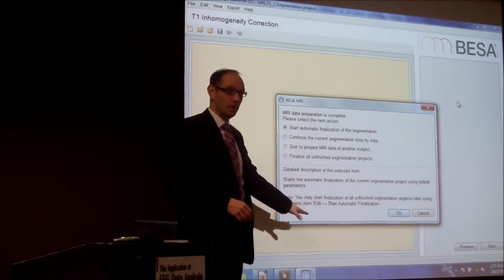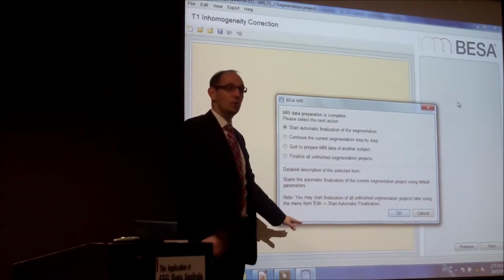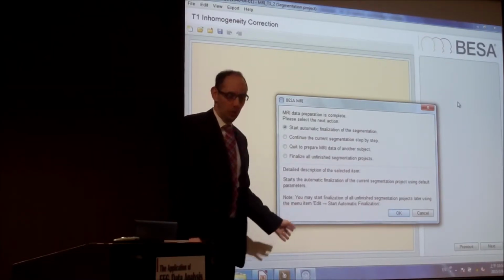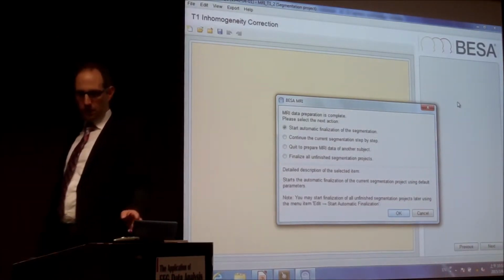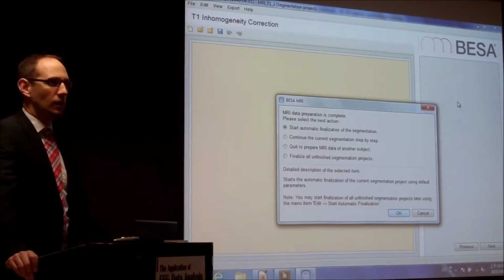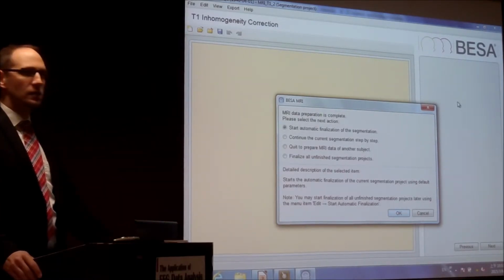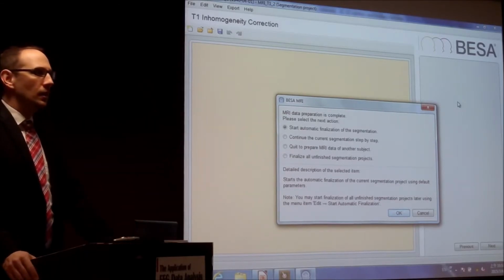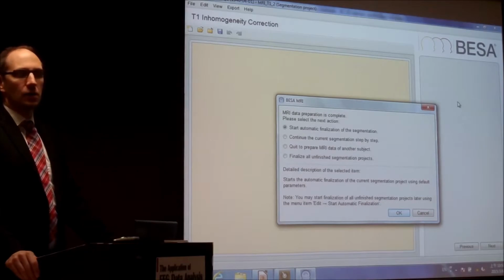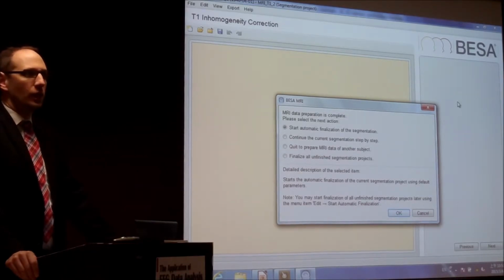After the steps we did now, there's no user interaction necessary until the end. And automatically everything is stored. So we know from a lot of people who just do this in the afternoon and do all of this volume conductor segmentation. This takes a little time. Then they can start it and they can go home, and the next day they arrive, everything's ready. And they can start over.